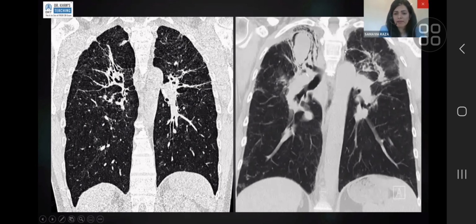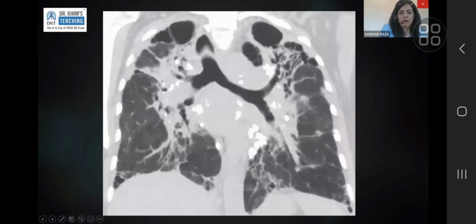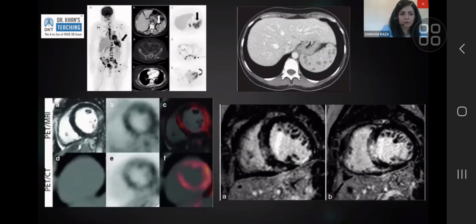So it's a very common complication in end-stage lung disease or fibrosis: when you have cavities, they do fill up with aspergilloma. This is a more typical appearance of the calcified lymph nodes and the volume loss. Again, a more advanced, more typical appearance, but if you can appreciate, it has gone down into the lower lobes as well. So the more severe the disease gets, the more it comes out of its comfort zone and starts going to the lower and mid zones as well.